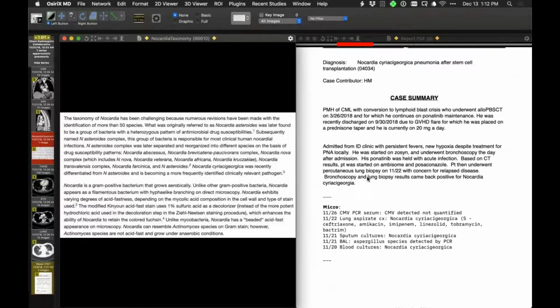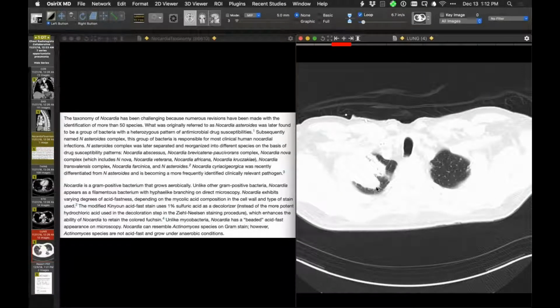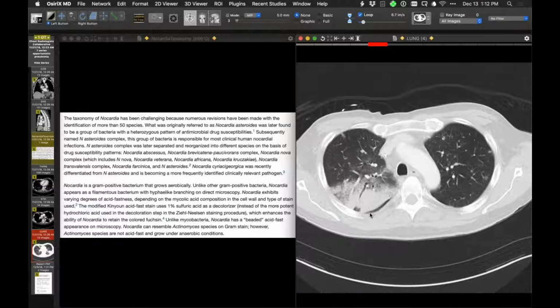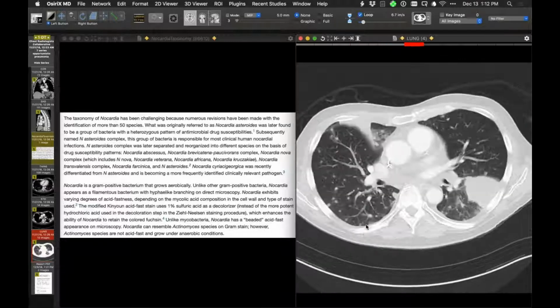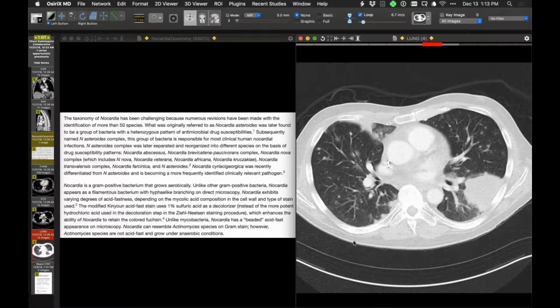I've seen this a couple times, Howard, and in my limited experience of a few cases, it looks no different than the standard nocardia asteroides that we see. Massive consolidation. Yeah, very, very large, multifocal, multilobar nodules, masses, pretty consistent with fungal or nocardia infection in this case.